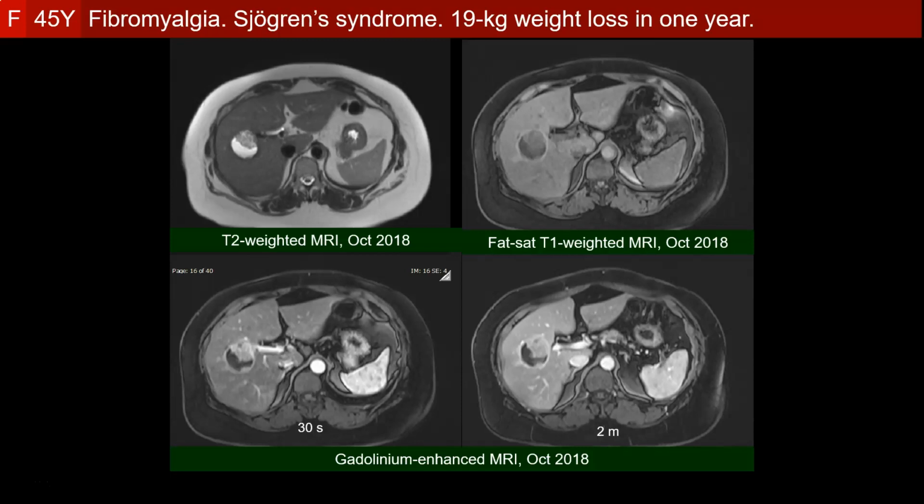its malignant nature. And during this period, there has been no primary that declared itself. So this points here to the possibility of a primary malignant neoplasm of the liver rather than metastasis. You may say that this does not look like the known primary tumors of the liver, the hepatocellular carcinoma and the cholangiocarcinoma, and this is right. This is a rather rare primary tumor of the liver, which is the neuroendocrine tumor.